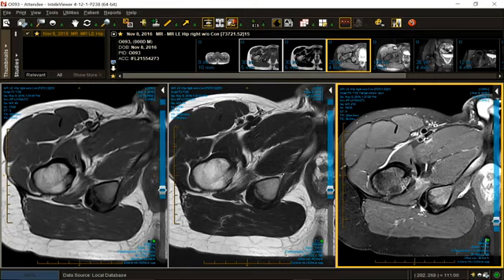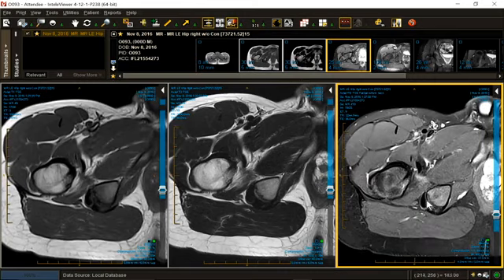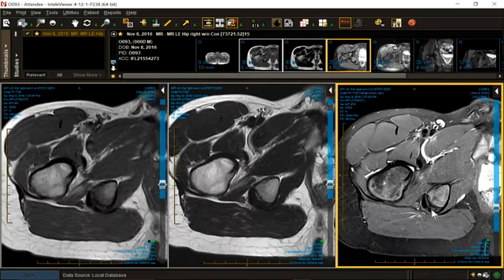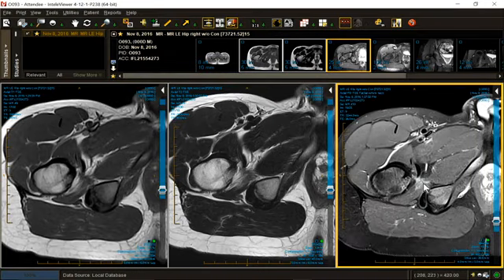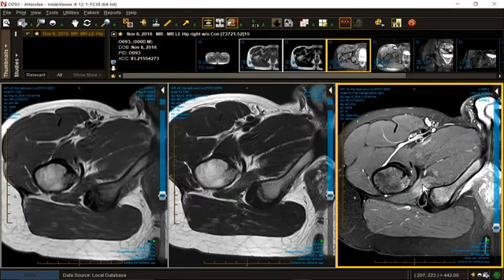So the semimembranosus usually has its own origin, and the biceps femoris and semitendinosus come off together conjointly. So this would be the conjoint tendon. This would be the semimem. Sacrotuberous ligament, adductor magnus. None of them are torn. So what's wrong? The patient has edema of the quadratus femoris.